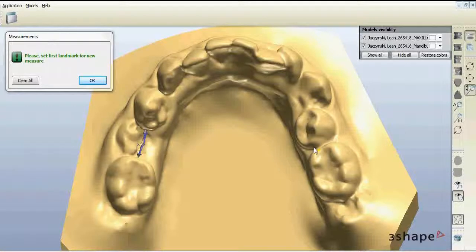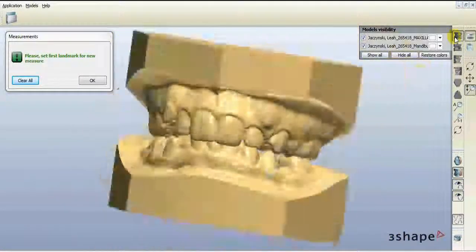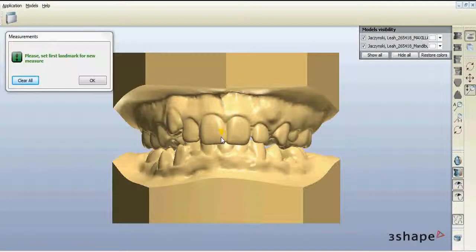You can come over to this side and measure this bicuspid and determine how wide that tooth may be. So this is about 7.5 millimeters, and you've got about 6.5 millimeters of space, so you know you need at least a millimeter in order to get that tooth in position. So it's a nice way of being able to demonstrate to your patient how much space is needed and the crowding that exists when you're treatment planning the case. And again, you're going to want to use this tool in a bunch of different areas and work with it to try to get the very best results from it and help aid in your treatment planning.